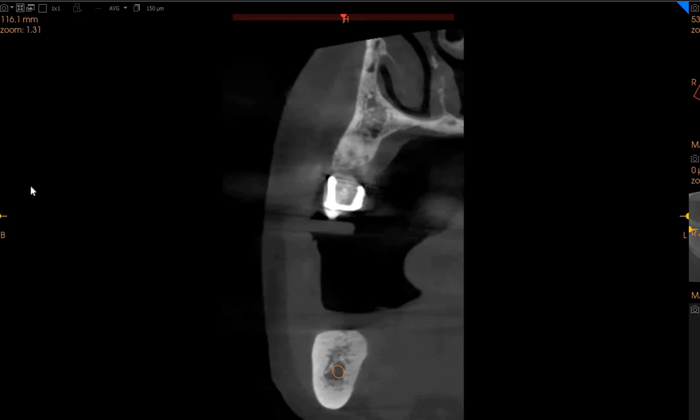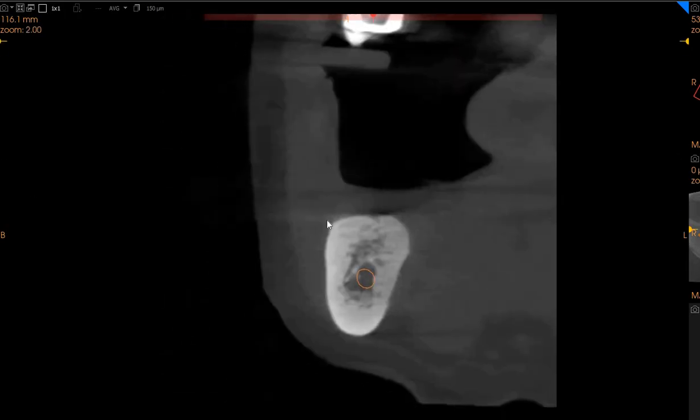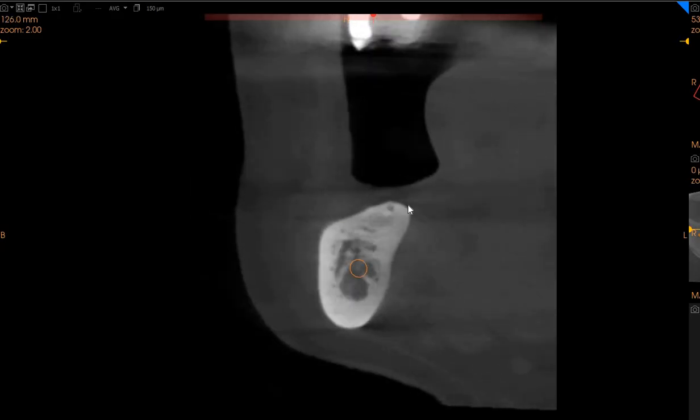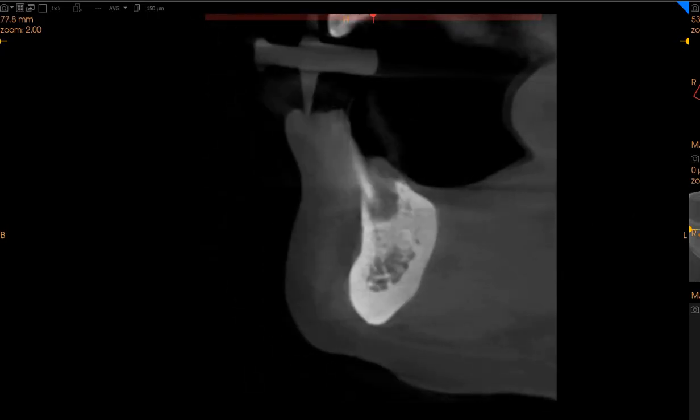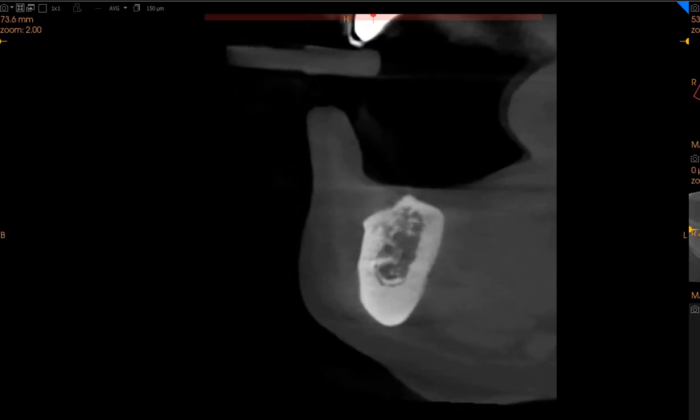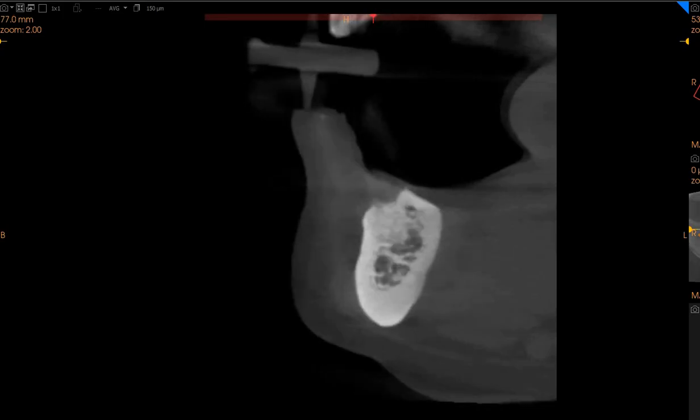I'm going to zoom in for the doctor so that they can see clearly. This here has D2 quality bone, very dense bone again, 10 millimeters of width, but only 6 millimeters of height. So a shorter implant, but there will be vertical augmentation needed. In the region of the 6, we've got again a very thin ridge generally, but a thicker ridge if we go deeper, and a ridge with a height of 7 millimeters. D2 quality bone.